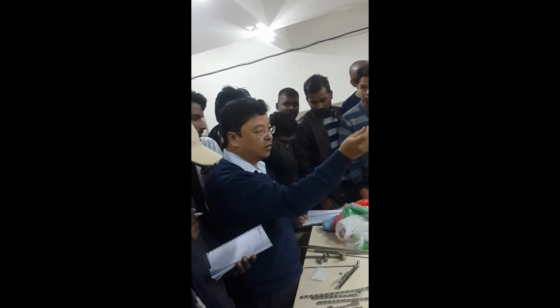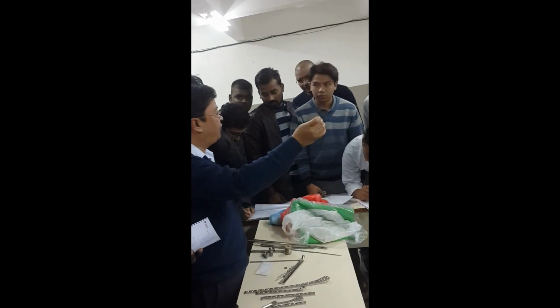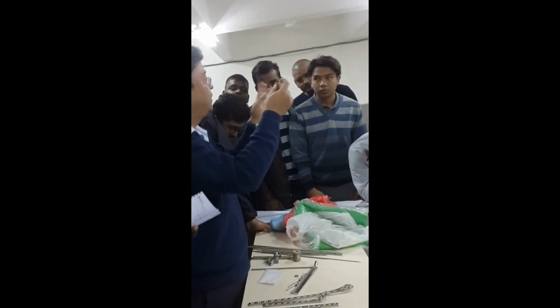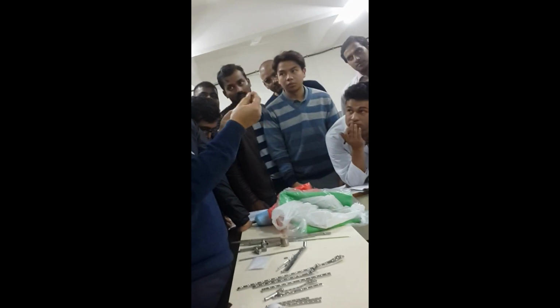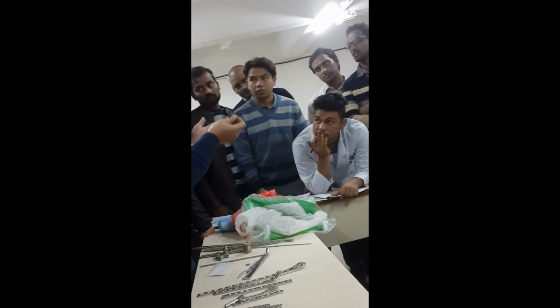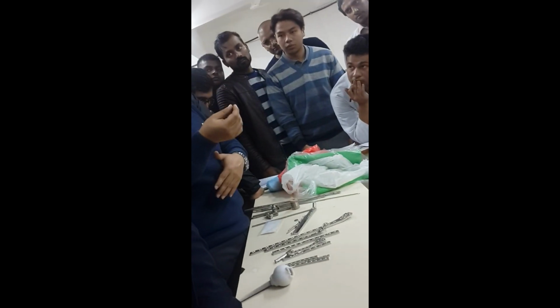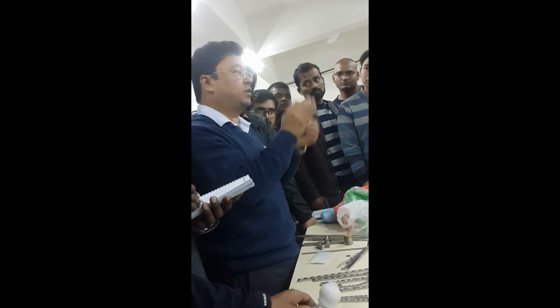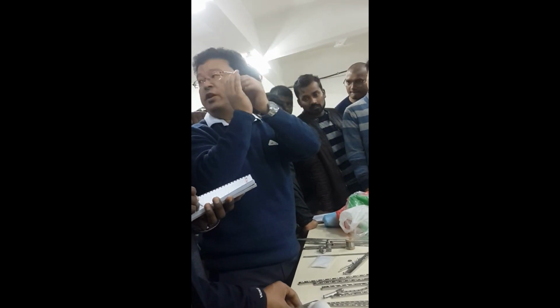When you get a Herbert screw like this, if you say scaphoid, then they ask you about the vascular supply of the scaphoid. Then what are the other sites where there is a tenuous blood supply? You have to say the head of femur and talus. And if you want more marks, you can say one more, but if you stick to 3 it is enough. Ortho also, there is a watershed area.